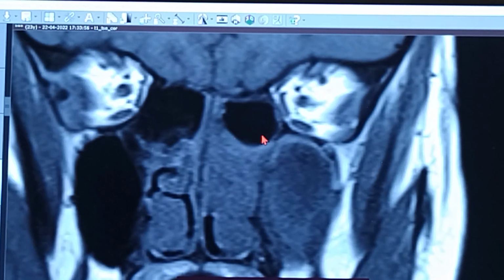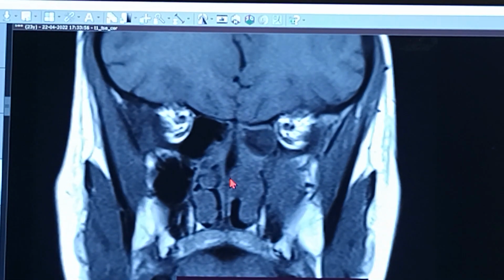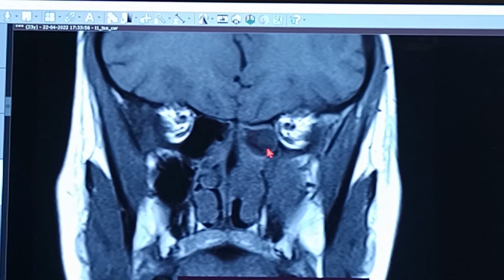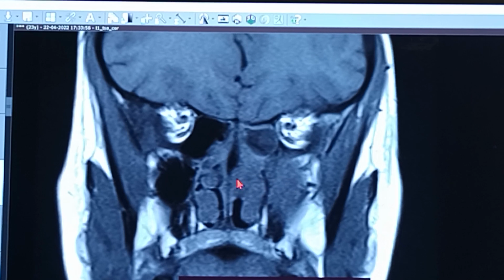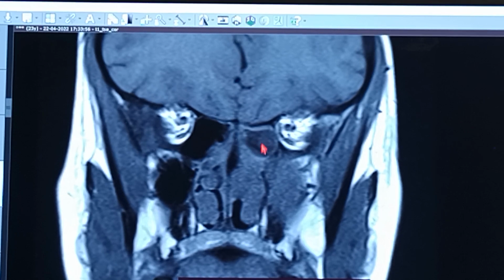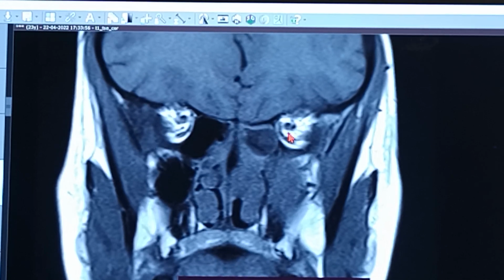And now moving further behind, this is interesting. If I zoom this out, this is the skull base. Now this is the posterior ethmoidal skull base, as it is becoming more horizontal and flat. Something interesting you can see over here. Now this is all light gray, you can see somewhat, but this is dark gray. This is air in the right ethmoid, but this is definitely some kind of pus collection, which is in very near proximity to the orbital posterior apex area as well.